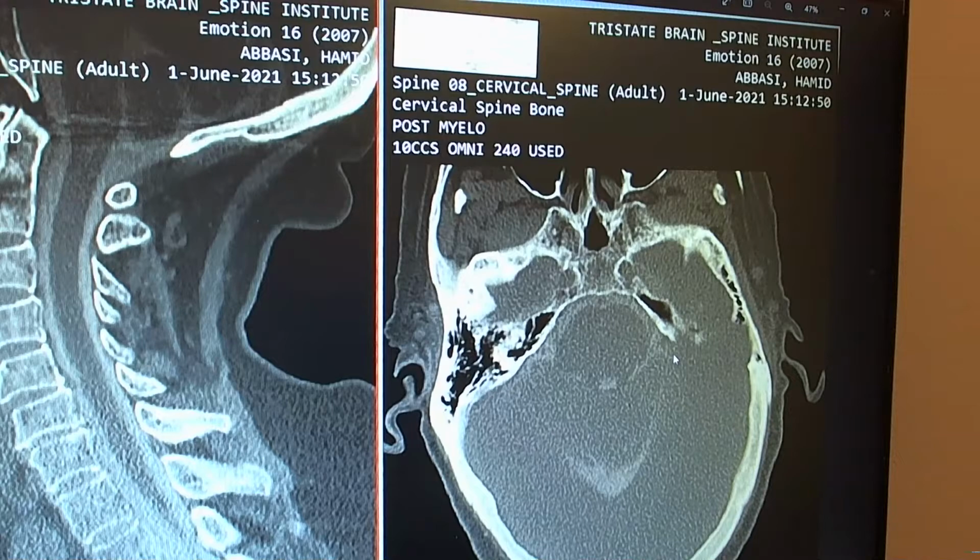Any takers? No, not really. Yes, that can take the mastoid cells away in one area. Sometimes we surgically remove them if there's an infection there. But the answer is much simpler than that. This cut is not exactly horizontal to the brain and the skull. Because it's angled, you see the mastoid cells on one side and not on the other side. So it's a much more benign thing. It's nothing too complex, so you don't have to be worried about that.